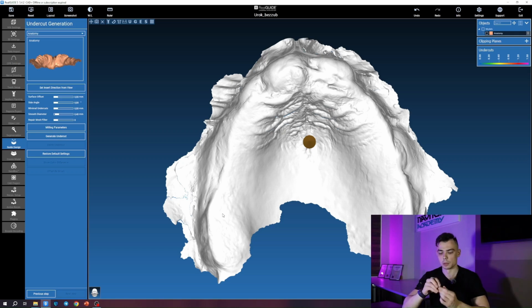Since I've already started talking about this, let me explain the rules for performing a CT scan with this guide. I'll go over this again once we've actually made it, but still. First, the guide should not be coated with anything on the inside because that would affect how it fits against the mucosa, and it's very important for us that the 2 contours match. Second, remember that this is a prototype of the future surgical guide. And third, this thing needs to have a repeatable position.